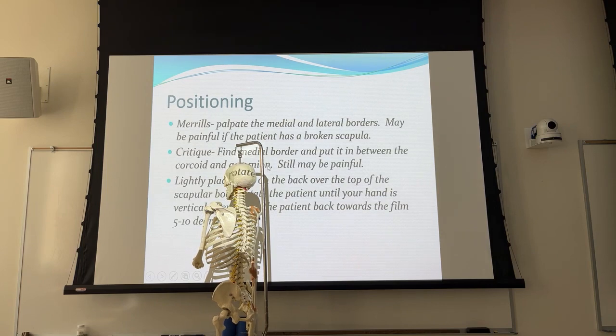Okay? So we talked about the positioning: put your fingers on the vertebral and the axillary border and oblique until they're superimposed, and good luck with that. So that's my positioning there. It's a subtle obliquity from your hand being perpendicular.